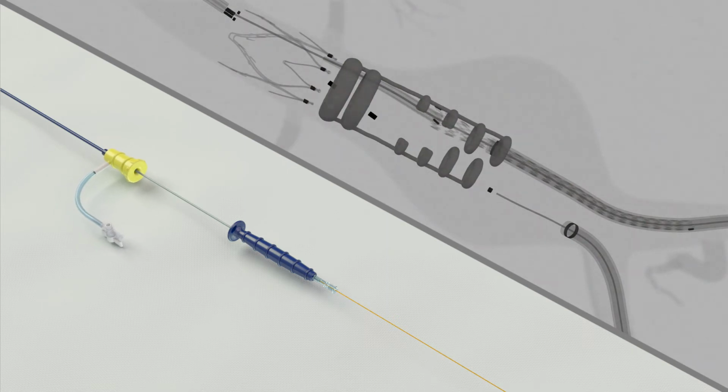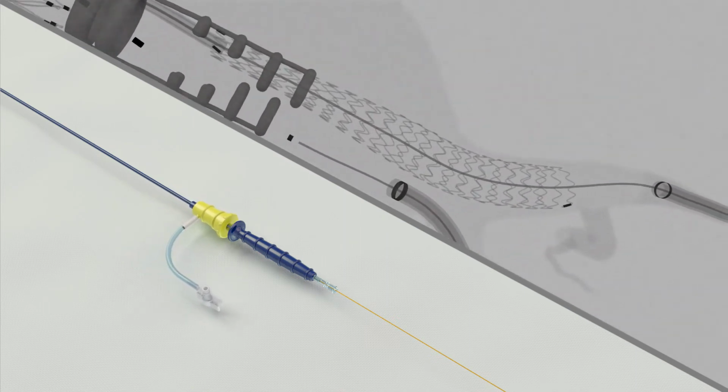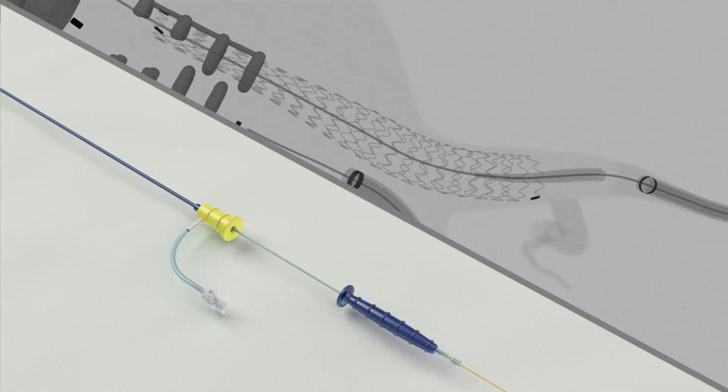Retract the outer sheath while holding the handle stationary to deploy the contralateral limb. Maintaining the position of the sheath, retract the handle until the nose cone is reseated into its outer sheath. The Ovation IX limb delivery systems are equipped with an integrated leave-behind sheath and hemostatic valve.